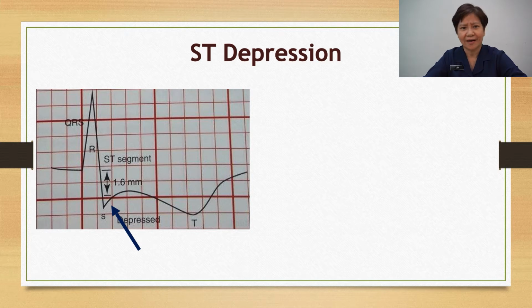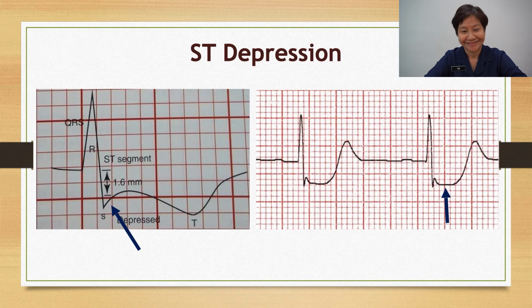So you feel very hard. Hey, what is this rhythm? That's why I let you all know something about the ST up and ST down. Okay, another example of the ST depression.